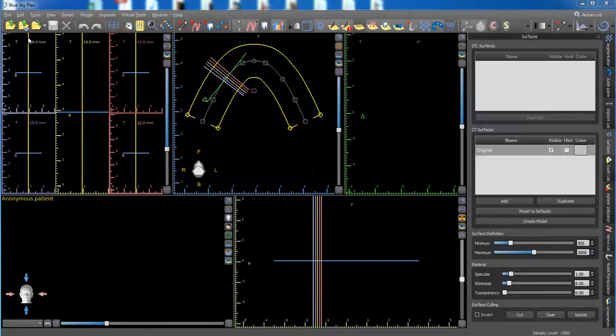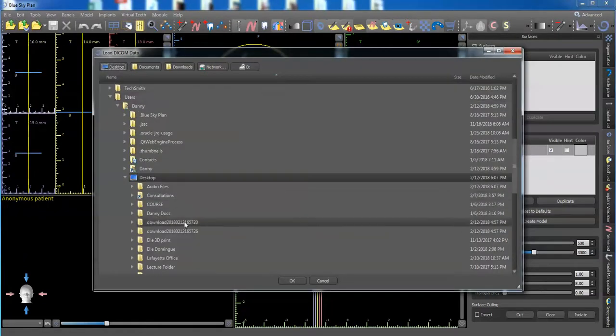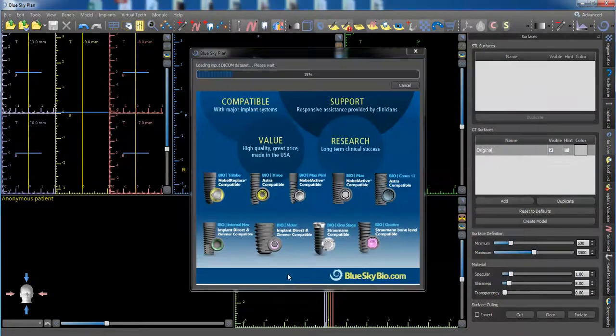This will be a quick single tooth implant surgical guide. We're going to do start to finish, so we'll go to new project, pull the CT scan DICOM files. I already have these pre-saved from my Prexion. I'm just going to import these.